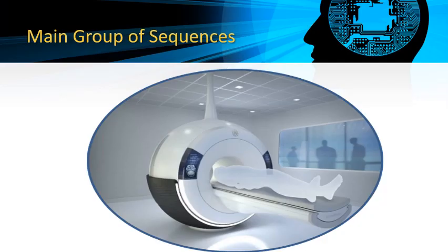In this video, we'll try to develop a simple and clinical approach for discrimination between the different MRI sequences beyond the toughness and hardness of the physics. So let us start. First of all, we can categorize the whole MRI sequences into two main big families.